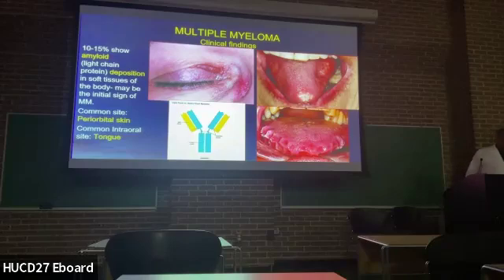This is similar to the amyloid material that you can see in the calcifying. Yes. Somewhat similar, yes.